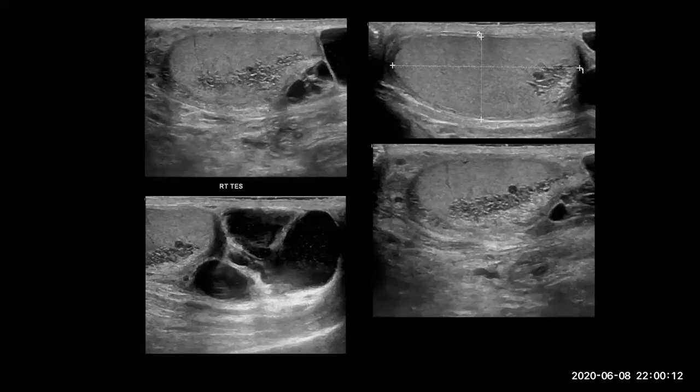I gave you two more pictures. This is a cystic structure. Epididymal cyst, multiloculated epididymal cyst. Yes. A multiloculated epididymal cyst can be associated with rete testis or rete ectasia. Okay. What is this tubular structure? What does it represent? In the testis, it is the tubular ectasia of the rete testis.